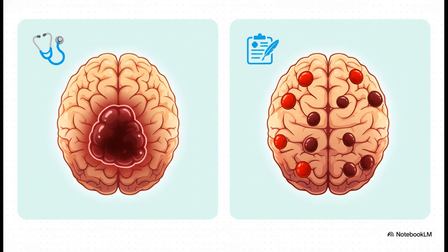If you have a patient with years of high blood pressure, you'd suspect a hypertensive bleed, which loves to happen in deep spots like the basal ganglia. But if you have an older patient and you see multiple bleeds of different ages scattered all around the brain lobes, you should really be thinking about amyloid angiopathy. The pattern tells the story.